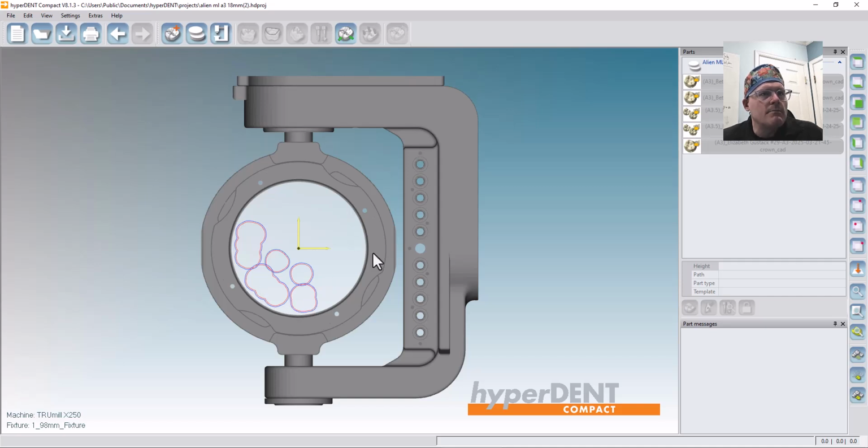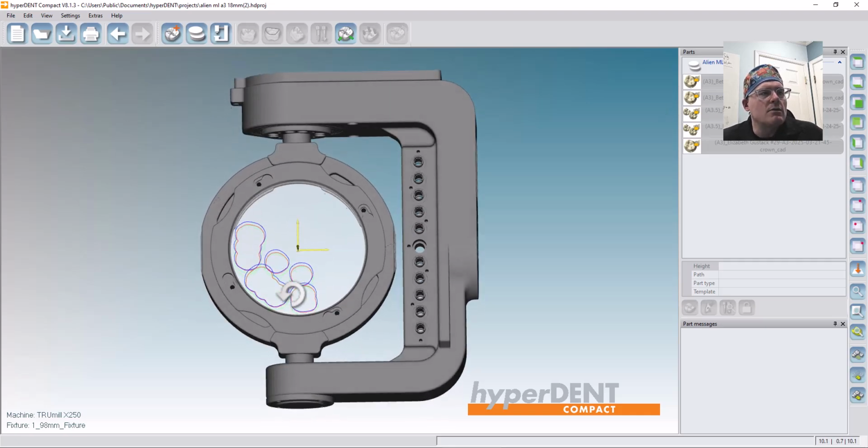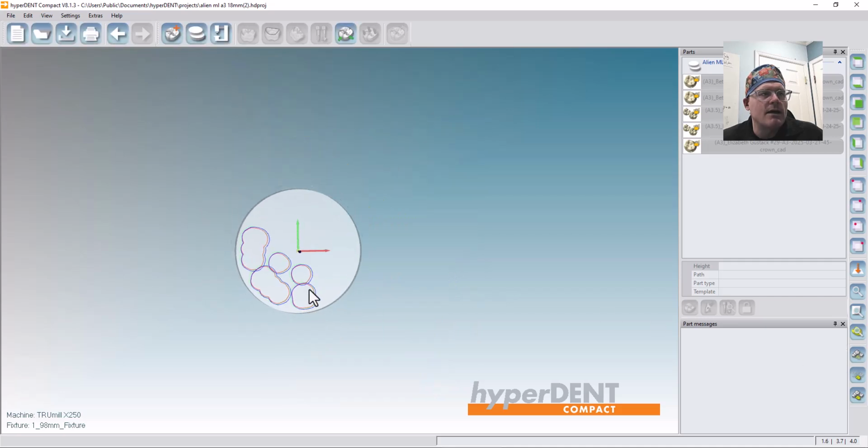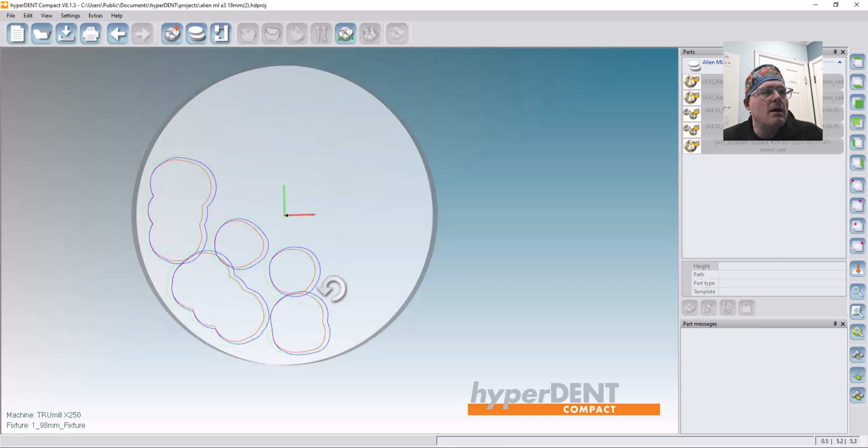And yeah, that's the patient. I had to mill that bridge twice. Oh, and this patient I had to mill that crown twice. So this is the puck that we're going to load. To get rid of this fixture, I'm going to highlight this thing so it all turns yellow, and this third button from the bottom on the right hand side, it says hide selected. So just get rid of that platform. So now I've got the right puck.